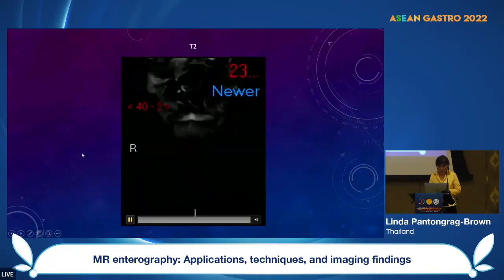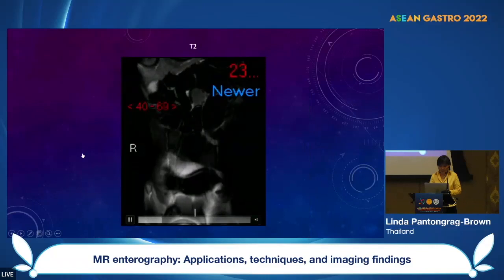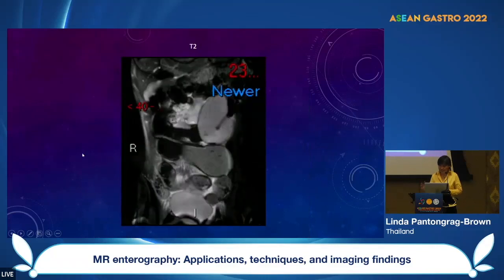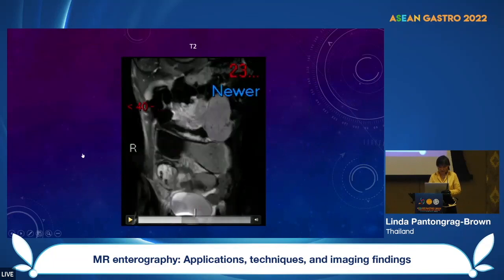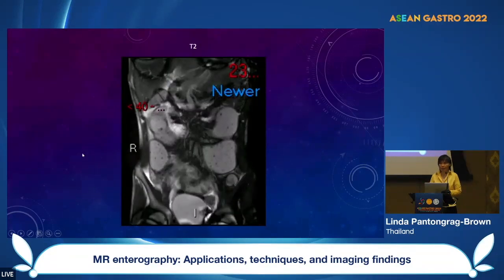I show you the view of cine views, and this is peristalsis of bowels up to upper small bowel, and here's a dilated bowel loop. It has some peristalsis, but you can see that it's sluggish. But notice this loop here, which is abnormal. It shows stricture, narrowing, and motility is much decreased or almost none. Look at it again, see that? No movement of this segment of the bowel wall.